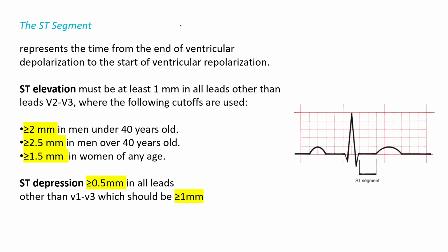Now let's go to the ST segment. The ST segment comes right after the QRS complex. By the way, this point where the S wave comes back to the isoelectric line is called the J point. Remember that we're going to need that. If it came back higher, for example, let's say it came back here, then we have the T wave. This point is again called the J point, and we say the J point is elevated. This is the hallmark of ST segment elevation.